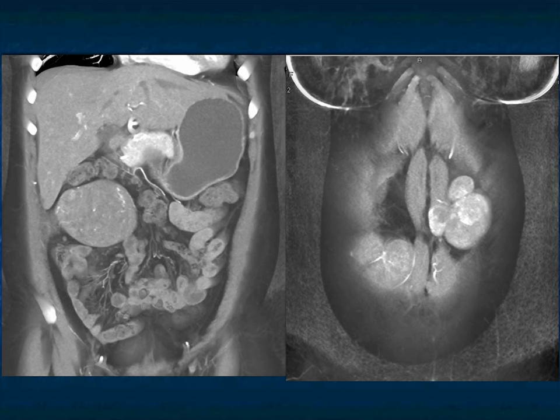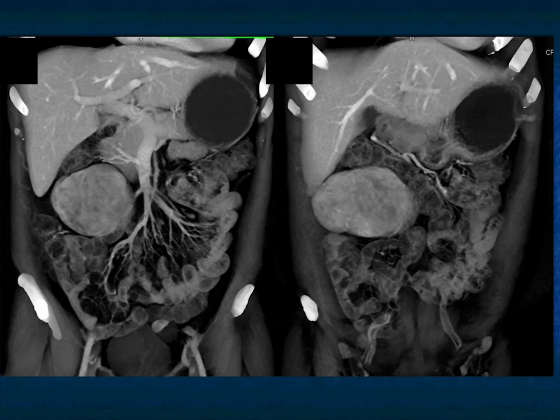Endometriosis, you can see here some more images, and you can see there is a mass also in the abdominal wall in the right lower quadrant. I find endometriosis to be extremely challenging because it's a wonderful mimicker. It's a great case at conference, but you always need to at least think about it, particularly in difficult cases.